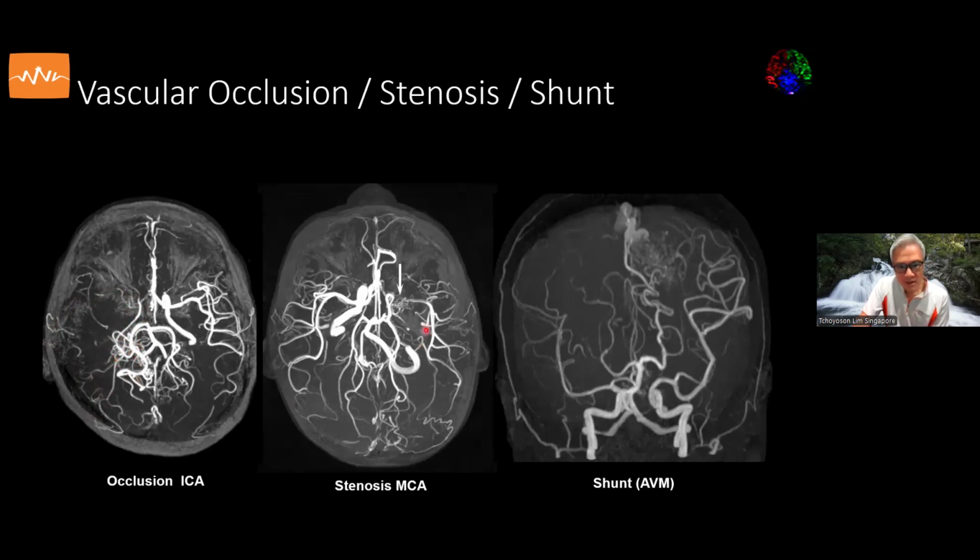territory. A different patient with unilateral narrowing of the MCA compared to the opposite normal side, there is poor filling and poor flow signal in the narrowed but not occluded MCA.